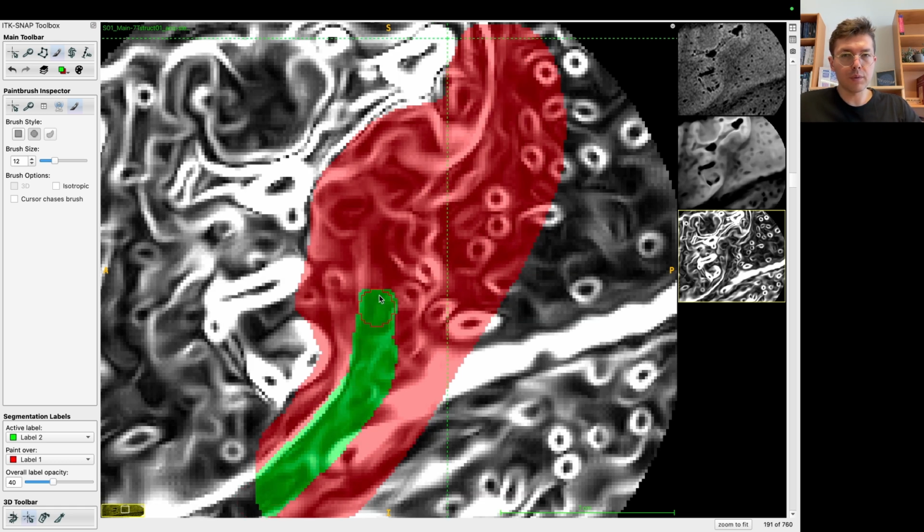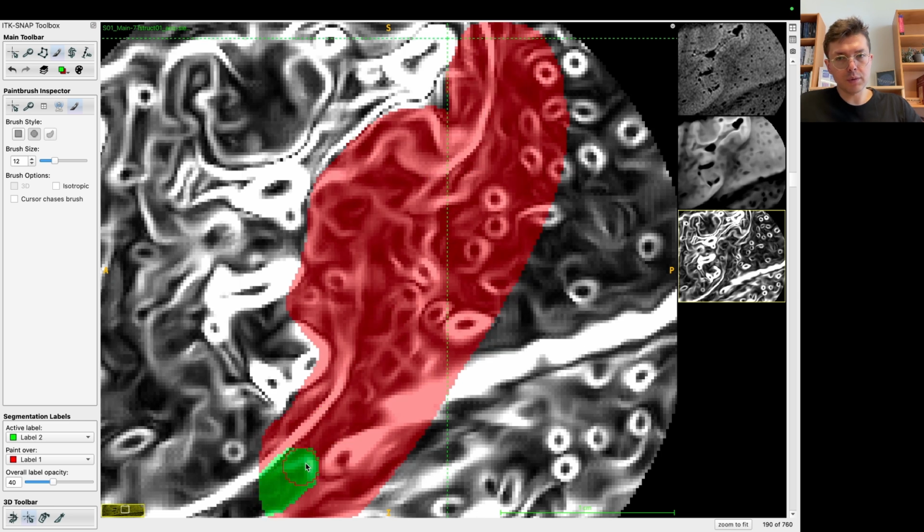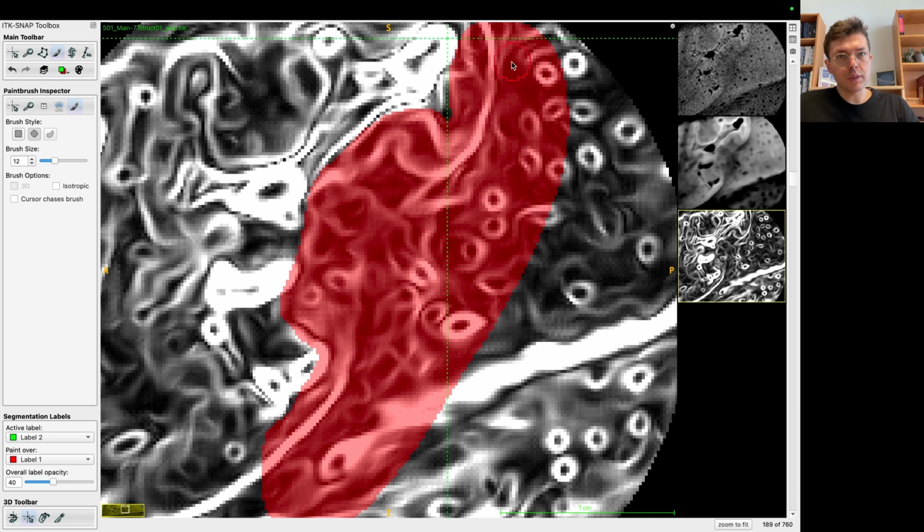It's a bit too low SNR, not to the level that it's unworkable. As I mentioned, we can make these heuristic based judgments on where to put the Heschl's gyrus boundary for white matter and gray matter, but we just have to live with it. I mean, it's a good data set at the end.